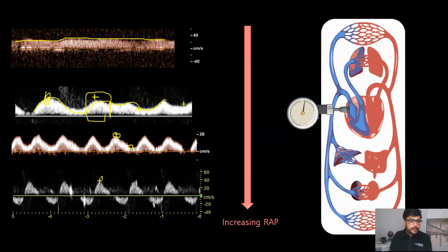But just visually you can appreciate. I mean, normally it should be less than 30% pulsatile. And if it's somewhere between 30 and 50%, you call it moderately increased congestion. And if it's more than 50% pulsatile, you call it severely congested portal vein. In this example, it's probably maybe 80% pulsatile or something visually. So you can call it severely congested portal vein.